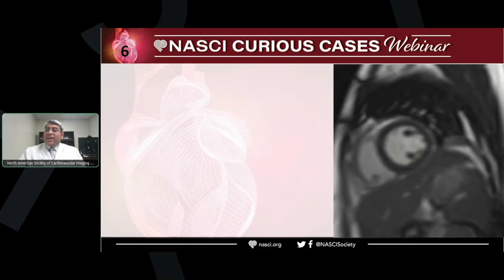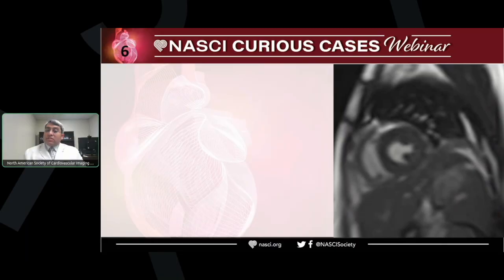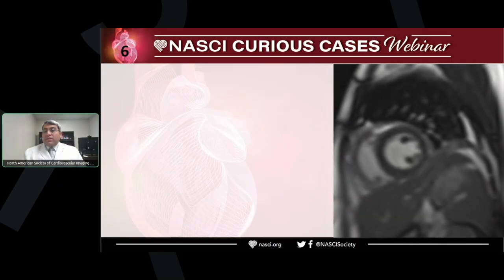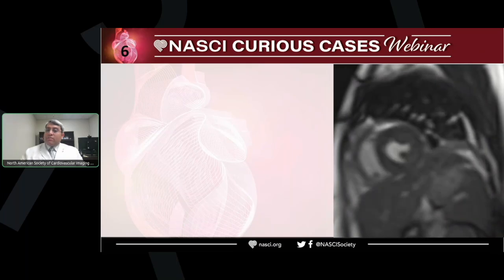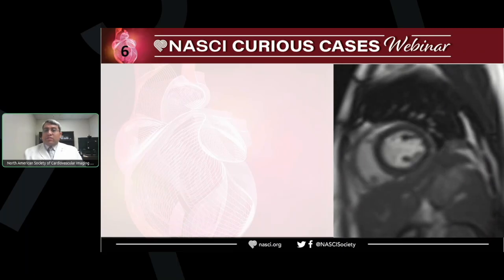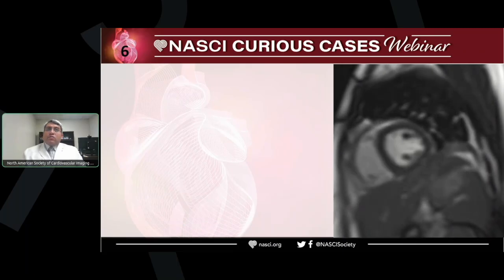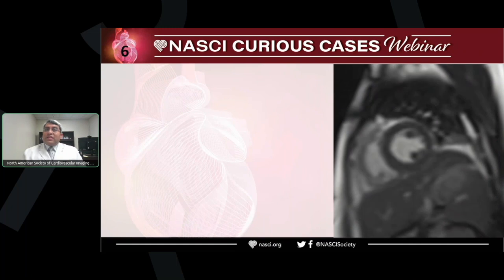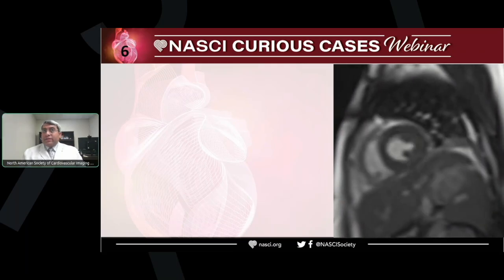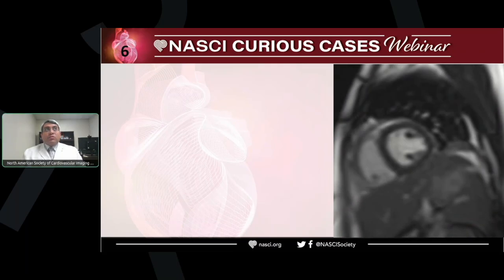Exactly. Definitely there is septal bounce during the cardiac contractions, and during deep inspiration there is some flattening of the interventricular septum, which is ventricular interdependence. And this finding, you will see it in which abnormality? Constrictive pericarditis? Or recently, constrictive physiology?